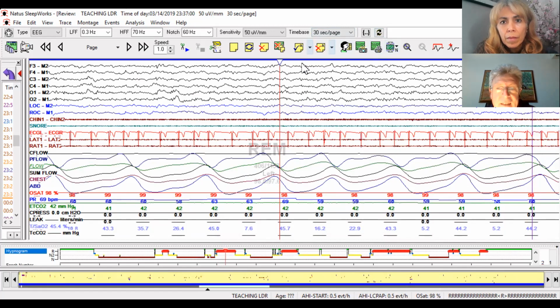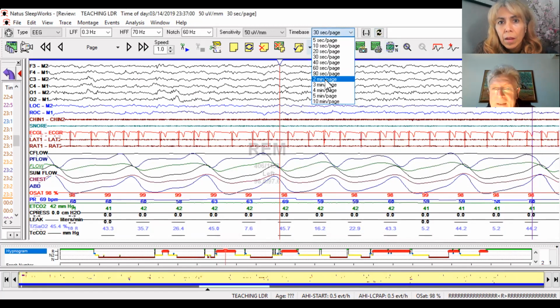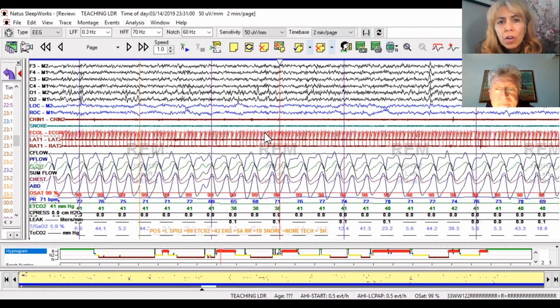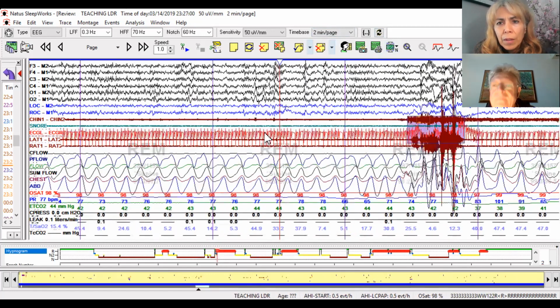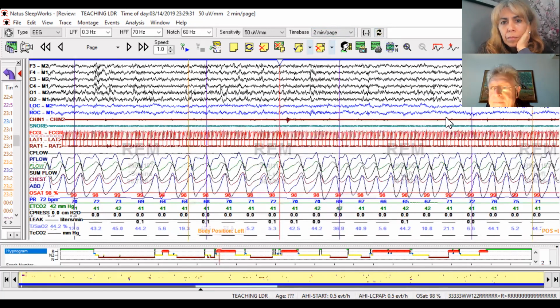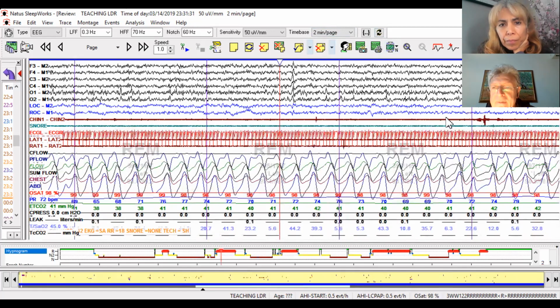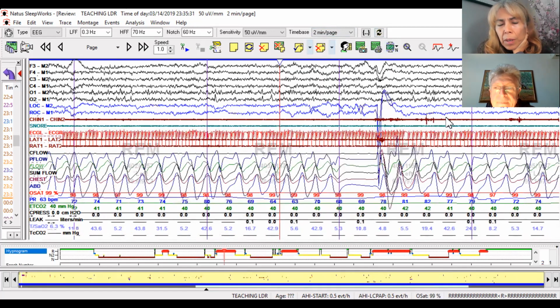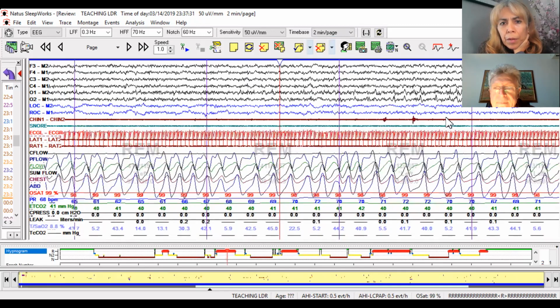It remained atonic, but something was changing. So maybe it took a little longer for that chin to go back down after that movement. No, that's what it was, this part up to here. Right. Okay. That's interesting. Here we have a brief central apnea, no movement.